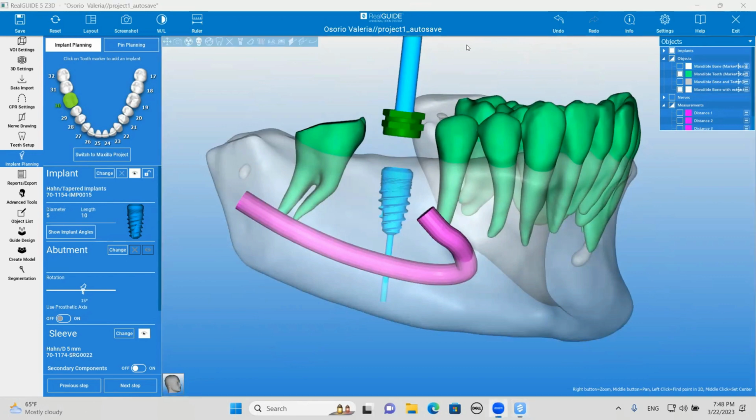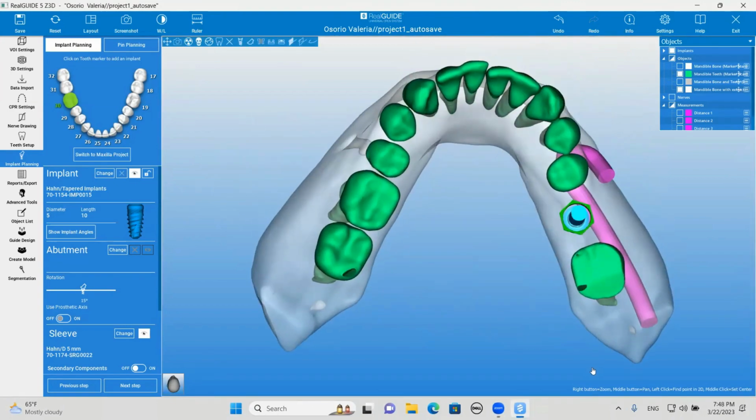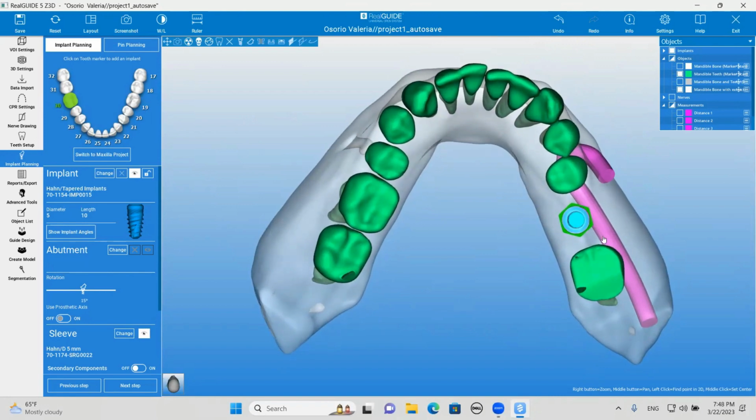And you can go, so see, let's say your case here needed bone, or we had to decorticate it. I would decorticate on the mesial and on the distal significantly, okay? And then over top of it, if you look at it, let's look in an occlusal view, Hussein. And can you make it radiopaque?